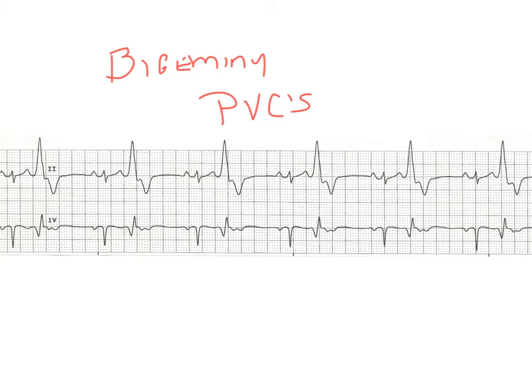This is also bigeminy PVCs. Again, these are probably not perfusing rhythms. See how wide they are? All right. They're unifocal in nature because they all look alike. We could probably, again, measure and have a pretty good idea what our pulse is. We have a compensatory pause. It's actually pretty cut and dry bigeminy PVCs. Very dangerous if there are this many per minute.